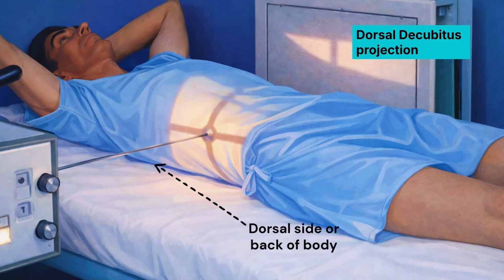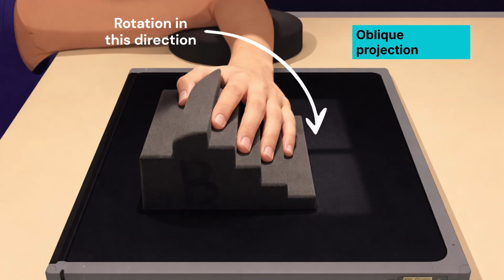The key point is this. The projection is chosen based on the question being asked. Not all projections exist to show anatomy. Some exist to reveal physical behavior. Oblique projections describe the path of an X-ray beam directed to the anatomy of interest, at an angle. They are usually taken when the X-ray tube is angled and a patient isn't, or with the patient at an angle to the detector, but the beam remains perpendicular to the detector.